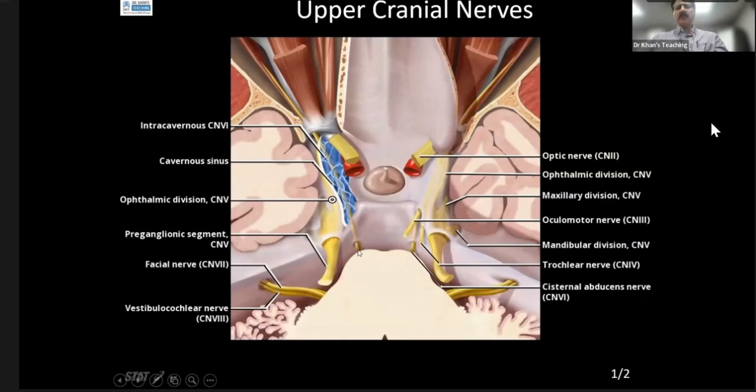Now, this is the 6th nerve, and slightly more superiorly, the 5th nerve is going anteriorly. This is the trigeminal nerve. It is a big, thick nerve, and we can see it very well on a CISS MRI scan. It goes into this part, which is known as Meckel's cave, very well seen on an MR, and it divides into three branches.